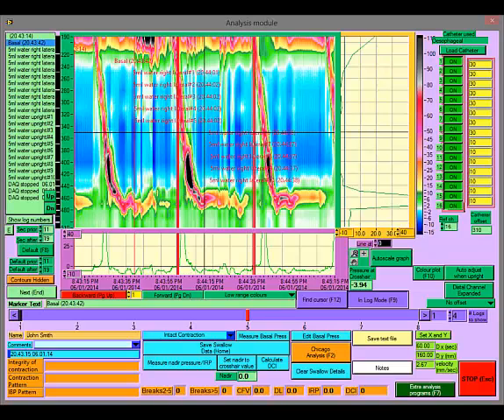First, we will look at the simple analysis. This is based on measurement of several nadir pressures and classification of a series of swallows. Two Chicago classification measurements, IRP and DCI, have been incorporated for you to use if you wish, but this is not necessary in the simple analysis.